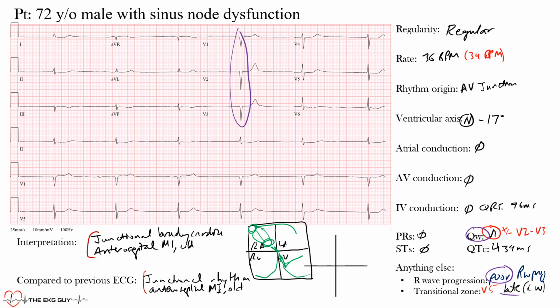And what you want to note is that different regions, okay, and we'll kind of say that the atria have their own intrinsic rate, which includes the sinus node. So we'll say that the atria has an intrinsic rate between 60 and 100 beats per minute. Okay, so pretty much the sinus node and all this atria.